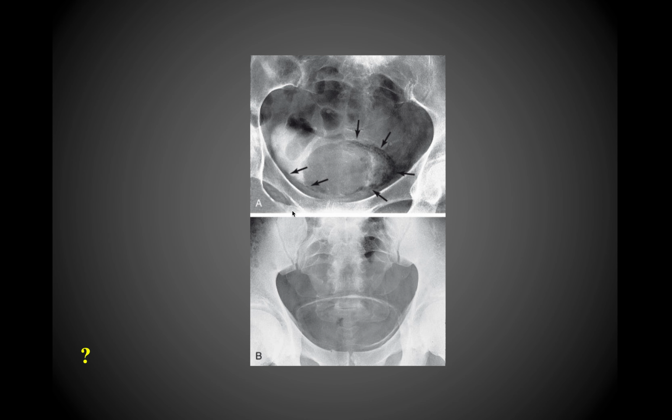Then we have a couple of examples here of various types of cystitis. Cystitis describes inflammation of the bladder wall. In the upper image here, you can see the dark outline in and around the bladder wall. That is a collection of air in and around the bladder wall, so that's just one type of cystitis. Down here, you can see this sort of hyperintensity around the periphery of the bladder, really within the bladder wall. That calcification is a common issue that arises with schistosomiasis.